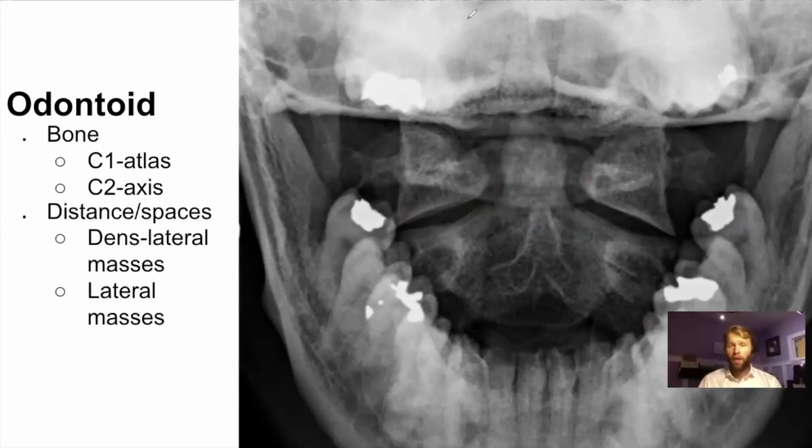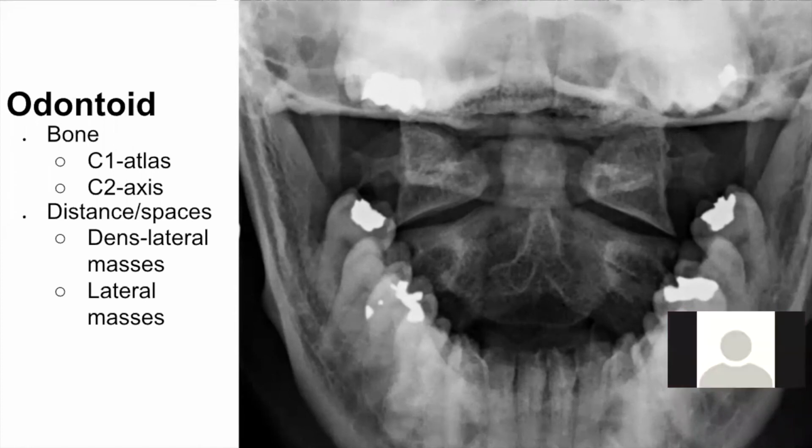No, that's good. I think if anybody's wondering, the white spaces, the white images that you're seeing on the teeth are fillings, by the way. Just in case anybody was wondering. Thanks, Max. You're welcome.